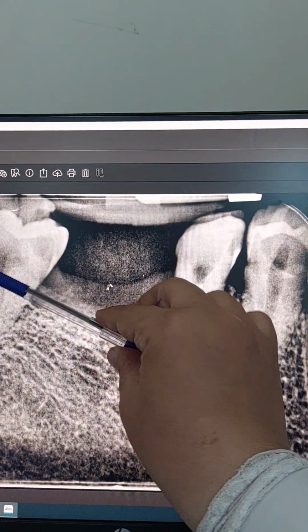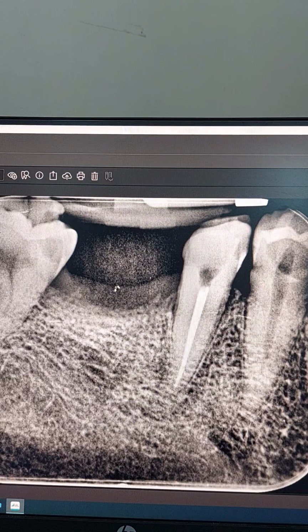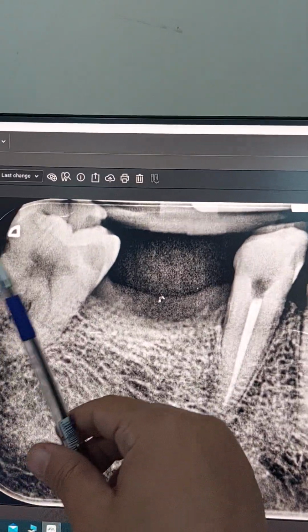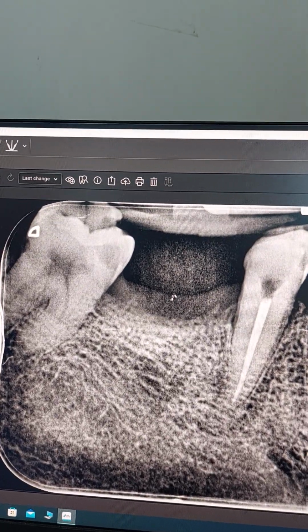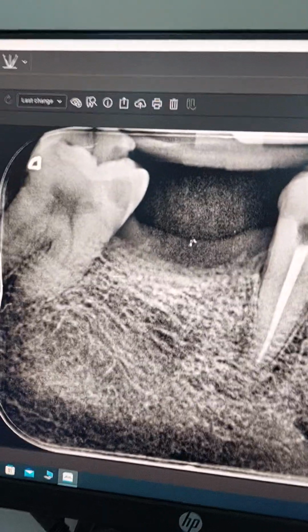Because which teeth are almost going upwards? 8. 8, not the 7. The 7 is still flat on the mandible. It's the 8 that goes into the corner where it rotates like this. So probably my evaluation is that this is an 8 with a lot of rotation anteriorly. Okay, very early extraction, and then rotated anteriorly.